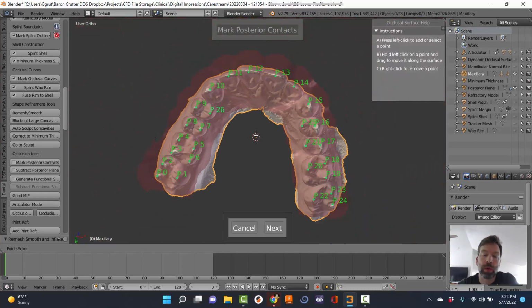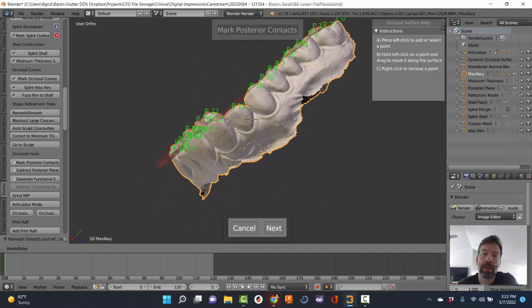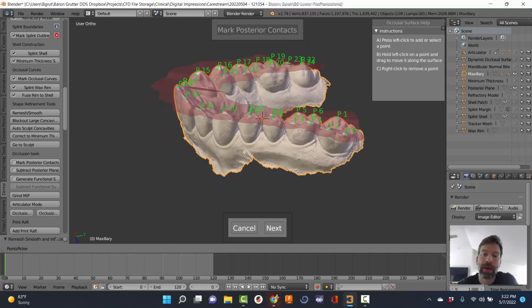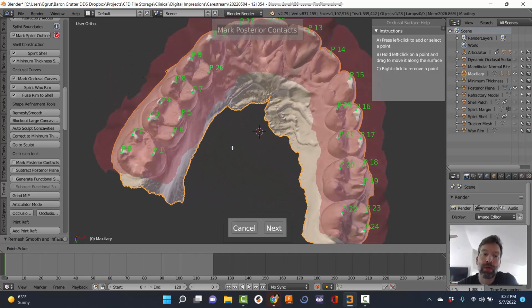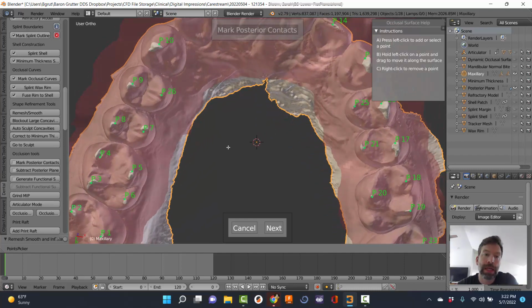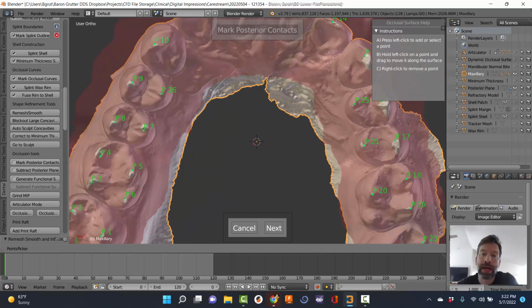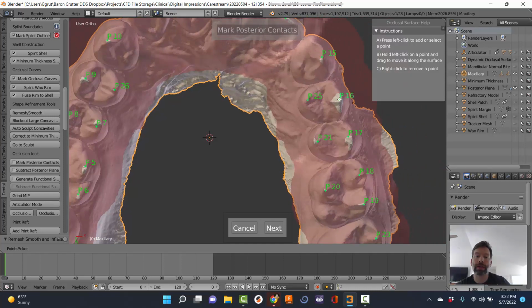What we're trying to do is create a surface that sort of flows like you imagine you were using this as tent poles and you draped a tarp over top of it. How would it look? That's the flat plane. If you find areas where they're very large, I'll grab this and try to find the highest point, trying to make the little areas poking through as small as possible. Not super critical, but a little bit of extra time doing that can possibly save you effort at insertion.